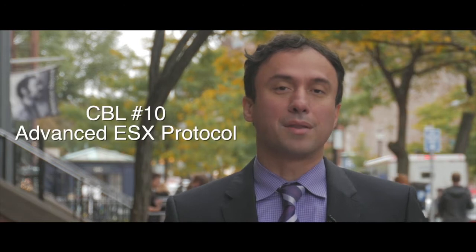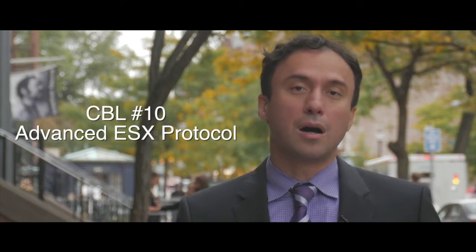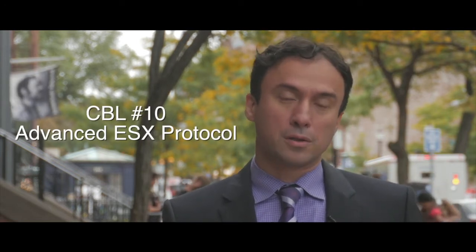We've already done about 9 CBLs, case-based learnings 1 through 9, that have been for the most part on EndoSequence as well as the ESX basic protocol. It's time now to get into the advanced protocol using the ESX file. In this video, we're going to talk about the indications and use of the ESX file in molars, as well as some of the more advanced cases where a different protocol is necessary than the basic protocol.